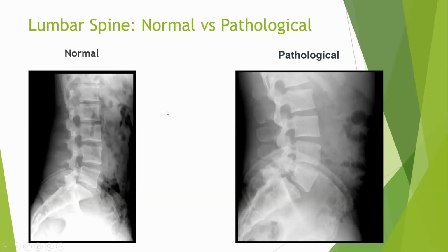Now, in the case of pathological, this normal is a 19-year-old male, obviously normal. And in this case, it's a middle-aged male with spondylolisthesis of L5 over S1. Possibly, if I am gauging it correctly, it's probably grade 1 listhesis or anterolisthesis. We usually call it listhesis and not anterolisthesis, but for retrolisthesis, we have to call it retrolisthesis because that is slightly rare.